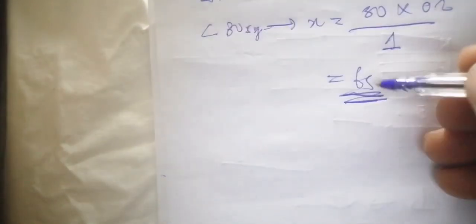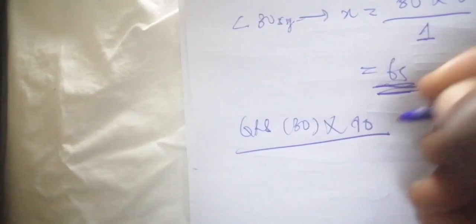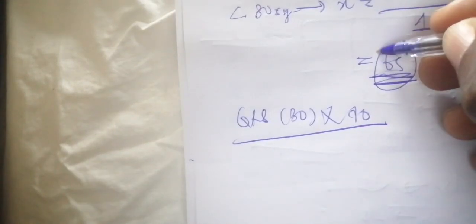You need to know that in the rule of 6, you take the number of QRS complexes that you visualize in 30 big squares, and you multiply times 10. And why is it that in the rule of 6 you multiply by 10 and in the rule of 10 you multiply by 6? The simple reason is that in 30 big squares you move for 6 seconds. Is it clear?